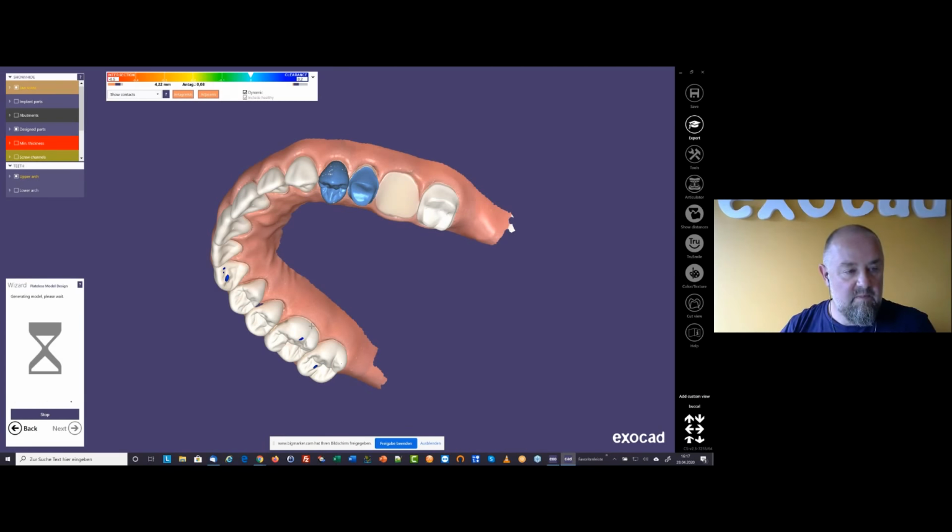Sorry for that. As I already said, if you have selected the correct pre-configuration plate in the beginning, you don't need to change anything here, but you are able to. On our exocad wiki page, you can find explanations of all the model creator parameters. I think end of next week, we will also publish a first tutorial on the model creator.